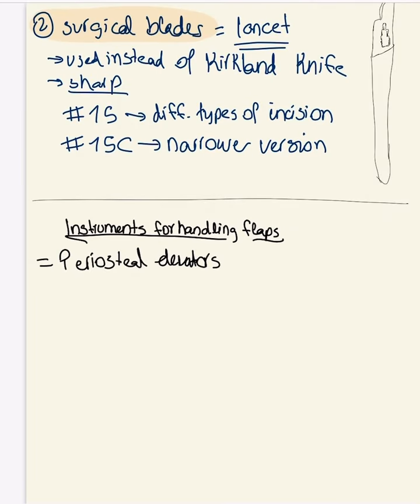So, hello. Assalamu alaikum and hello. Today I'm going to explain the instruments that are used for handling flaps. In another video, I will explain.